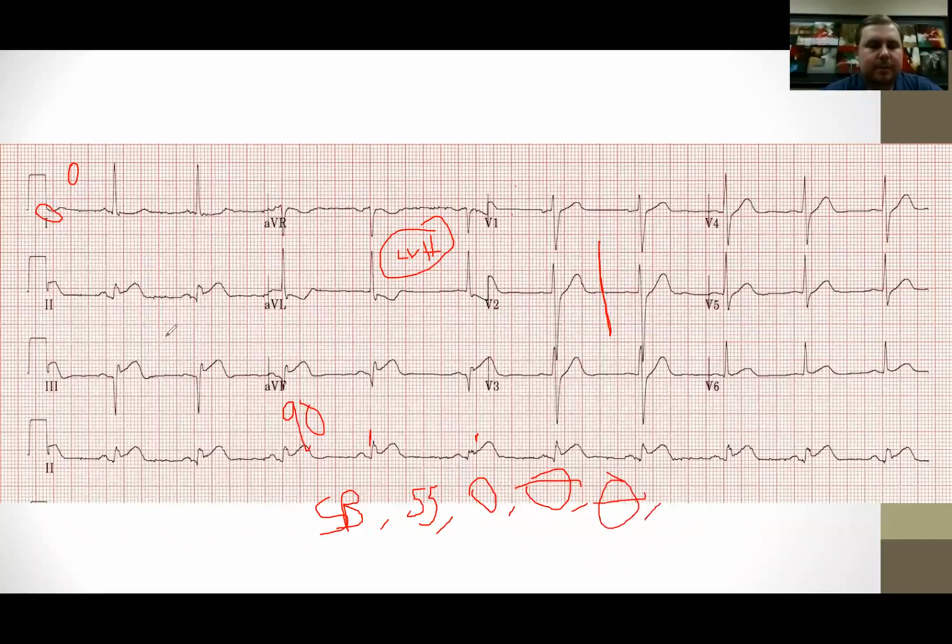And then finally, ischemia. Well, I have elevation down here in the inferior leads. I have a reciprocal change in AVL, not really anything in lead 1, then V1 through V6, I do not really have anything. I might have just a tiny bit of elevation out here in V6, but nothing that I would call lateral MI. This is just an isolated inferior MI.